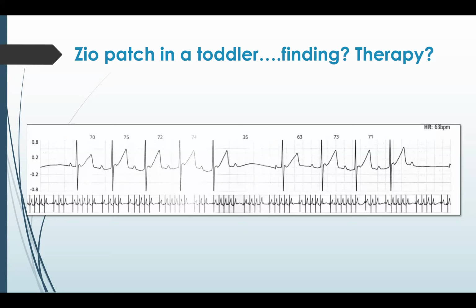And it's hard to tell. If I had calipers, I could. So do you think this PR is the same as this PR? It looks like it's getting longer in that beat, and then it looks like it's getting longer. So it looks like it's Wenckebach.